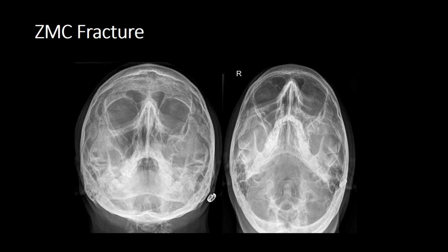Do we have a fracture through the superior orbital margin? No. Do we have an air fluid level in the frontal sinus? No, we have normal aeration. Do we have a black eyebrow sign? No. Line 2. So we go over the superior margin of the zygoma, up over the infraorbital margin, over the medial border of the orbital wall, up over the nasion, down the opposing side.